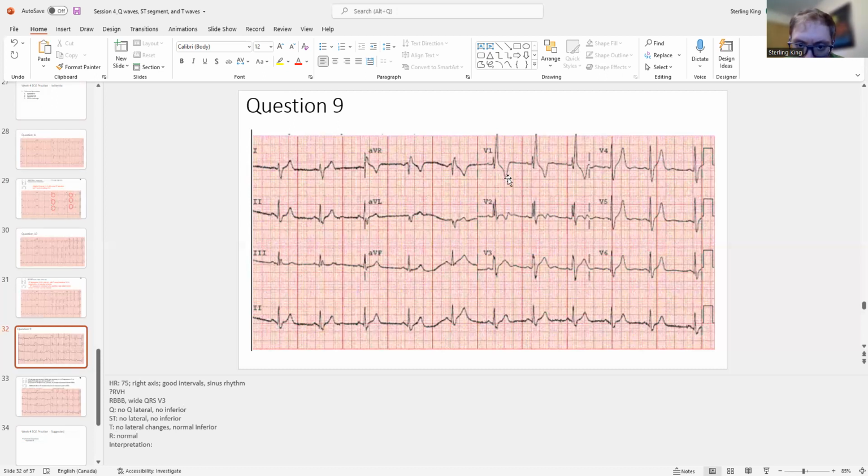So this T wave is inverted. Now we're trying to decide. It looks concave, meaning it's dipping in towards that direction. So this looks like strain because all of these are concave instead of convex or straight.